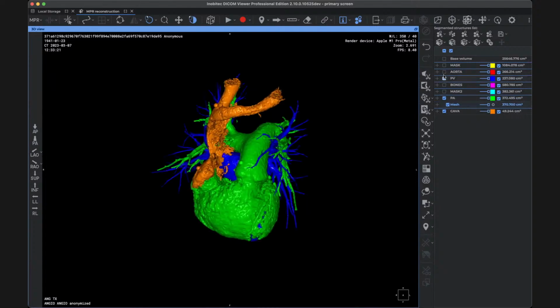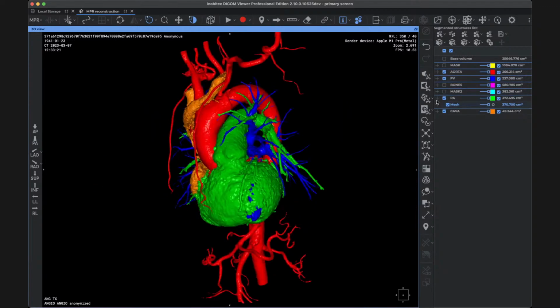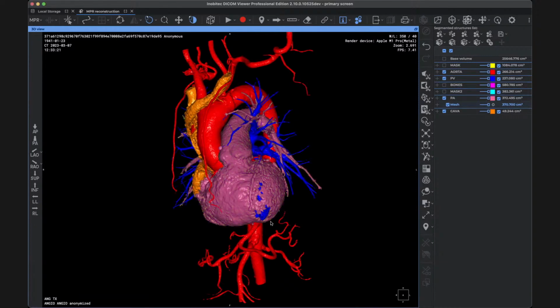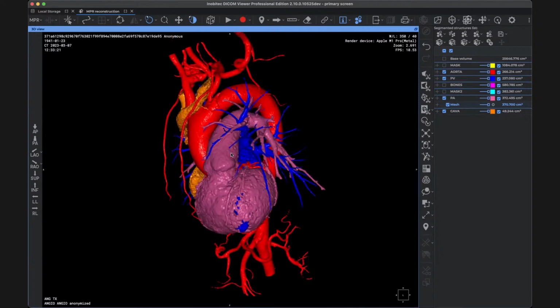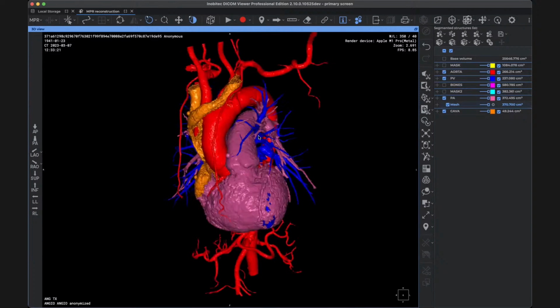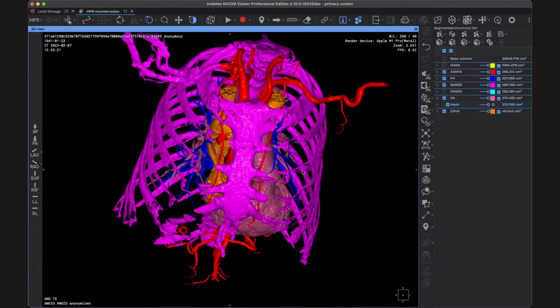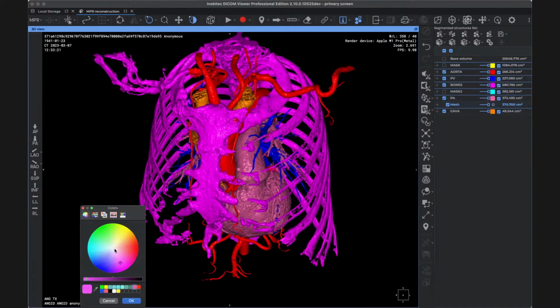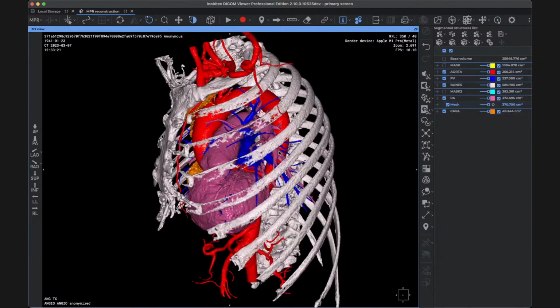And let's put the pulmonary vein and the aorta back in our final image. Let's change the color here to be more specific. Now it's okay. Now we have the pulmonary artery, pulmonary veins, aorta, and vena cava totally isolated, besides the bone structures here, also isolated. Change the color of the bones to be okay. That's the final result.